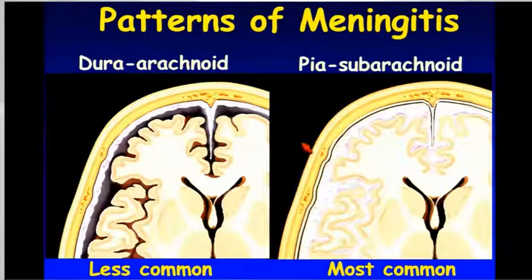So there are two major patterns of meningeal enhancement. When we talk about meningitis, theoretically you could be talking about either of these, but for the most part I think it's most appropriate to talk about a leptomeningeal pattern, one that goes along and into the sulci, that follows the leptomeningeal spaces, it surrounds the vessels, and that's why we get these secondary injuries.